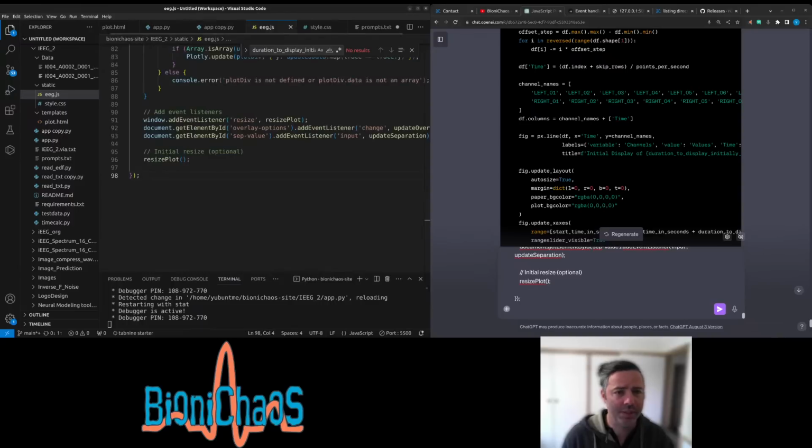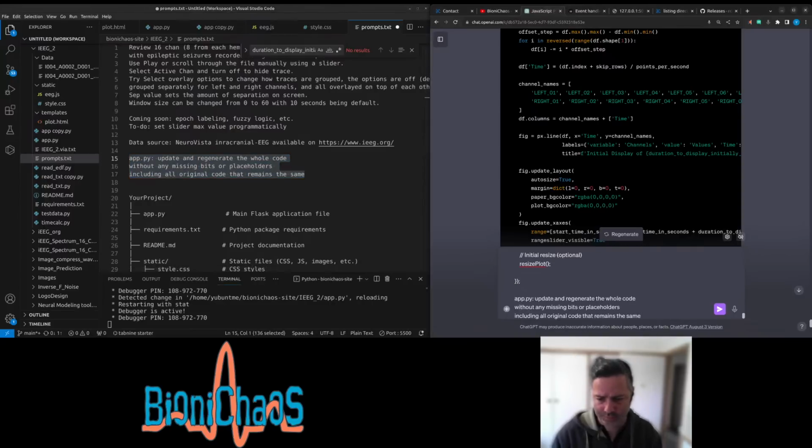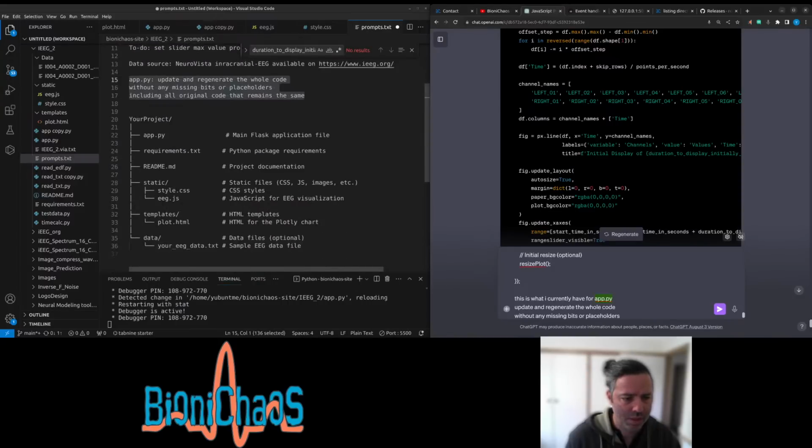So this is what I currently have for... no, wait, for... to be EEG JSON.